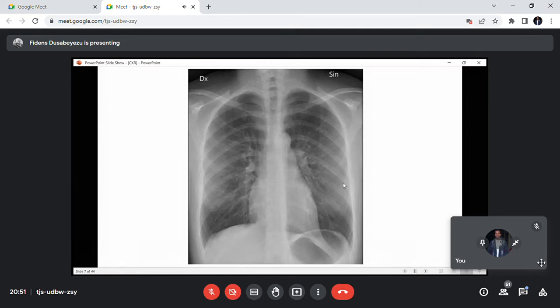I was telling you about the film in expiratory phase, as in a mild pneumothorax.